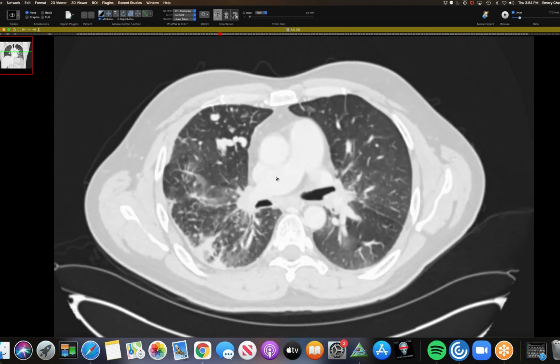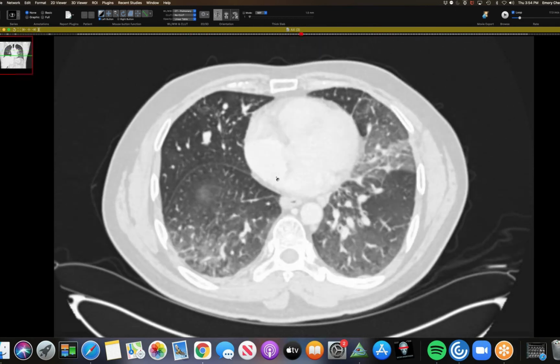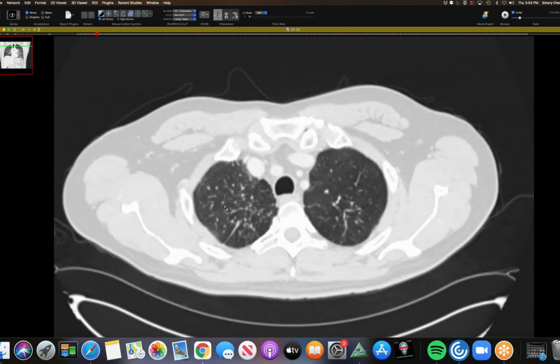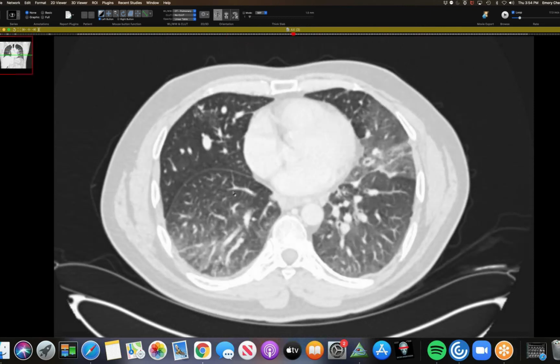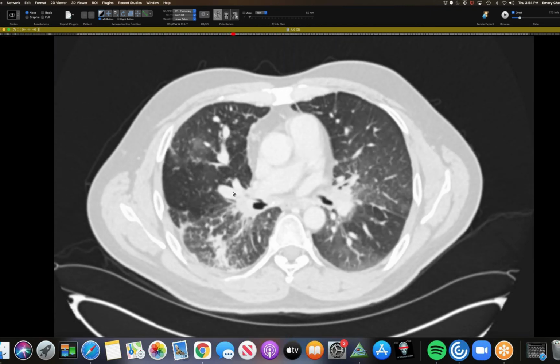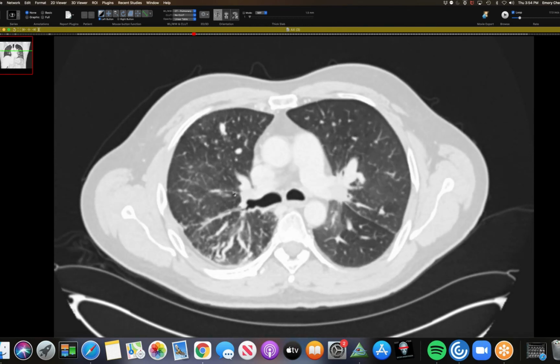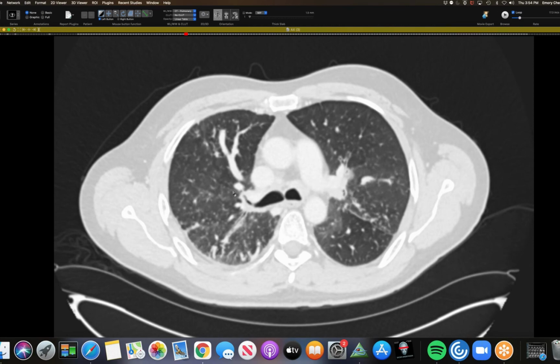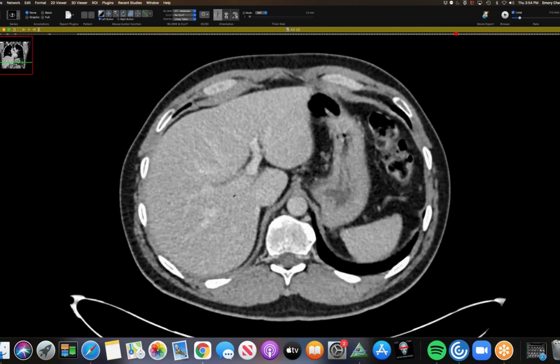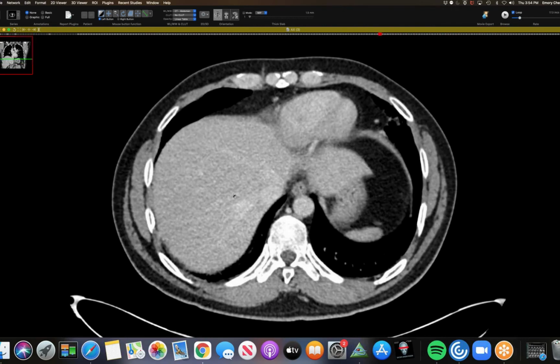I agree. So basically, you guys think this is a fibrosing mediastinitis from an infection, and you might have some mild silicosis. Or sarcoid. So sarcoid or histo, or TB? Can we look at the spleen, please, for calcifications? Nope. Nada. No, I don't like the lung nodules for histo.